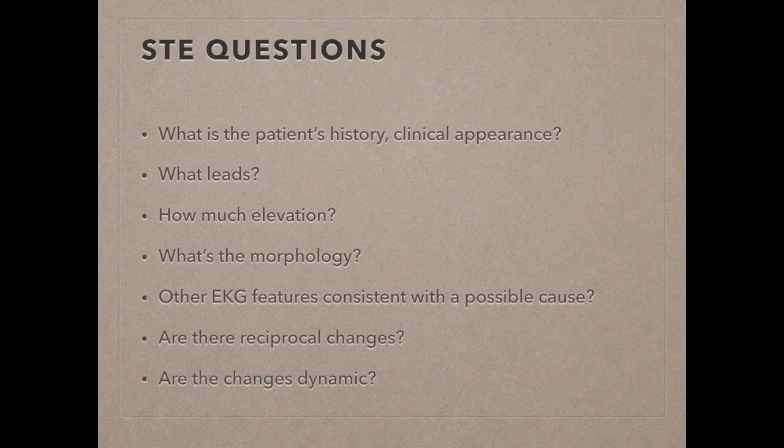What leads do we see the ST elevation in? And how much ST elevation is there? What's the morphology of that ST segment? Are there other EKG features that are consistent with another possible cause? Like, does the patient have left ventricular hypertrophy?